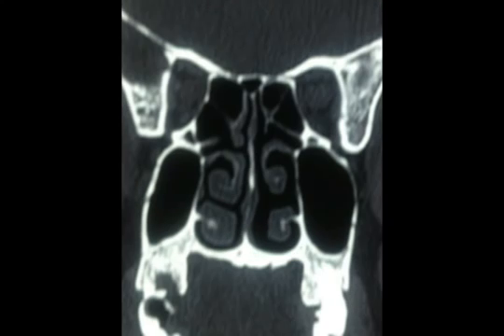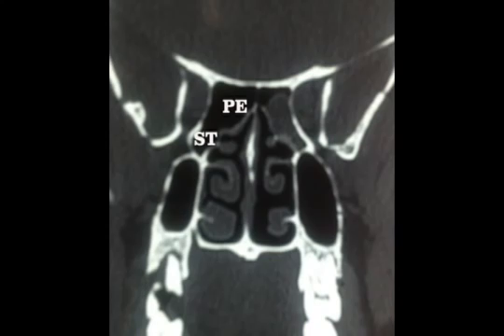So you can see here the posterior ethmoidal cells, and also the horizontal portion of the middle turbinate, the inferior turbinate there, the maxillary sinuses, the orbital apex, the inferior orbital fissure on both sides. So here you are tempted to read the left posterior ethmoid as sinusitis. Never do that. You can see the superior turbinate, posterior ethmoids on both sides. The superior turbinate is seen and the orbital apex is seen. Never read sinusitis right now because you will deviate from anatomy.